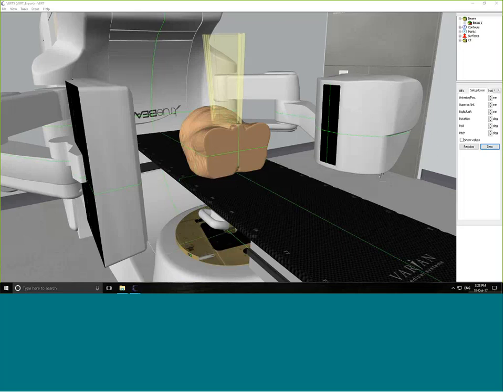Like I mentioned before, we've got a whole new DICOM loader, and there were some tweaks and changes that need to be done to allow people to bring in their own CBCT data. Currently, with this release, to avoid any further delay, we're going to work with just the 5 plans that we have. They've got 4 sets of daily images for the 5 plans, so that's 20 days worth of CBCT data. I think there's a lot there to get your head around and to work with, and it's all different areas of the body as well. So hopefully that'll be useful moving forward, and certainly for the next release we'll be looking at introducing own CBCT data import.